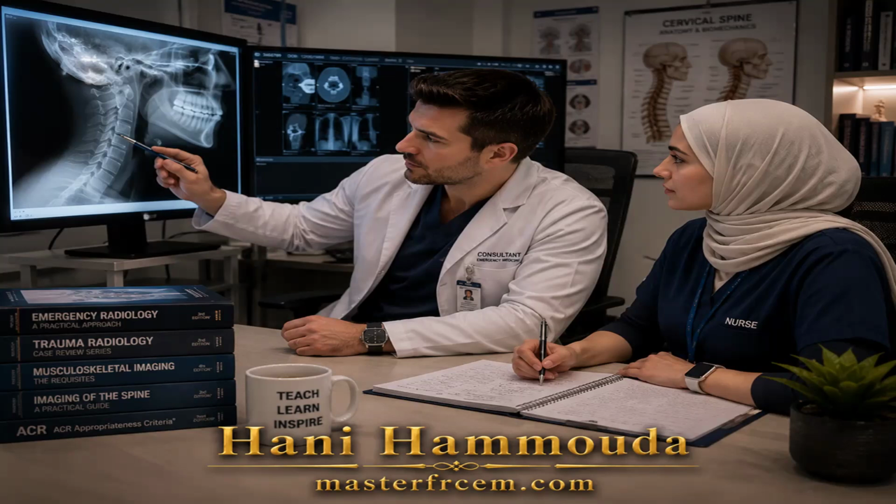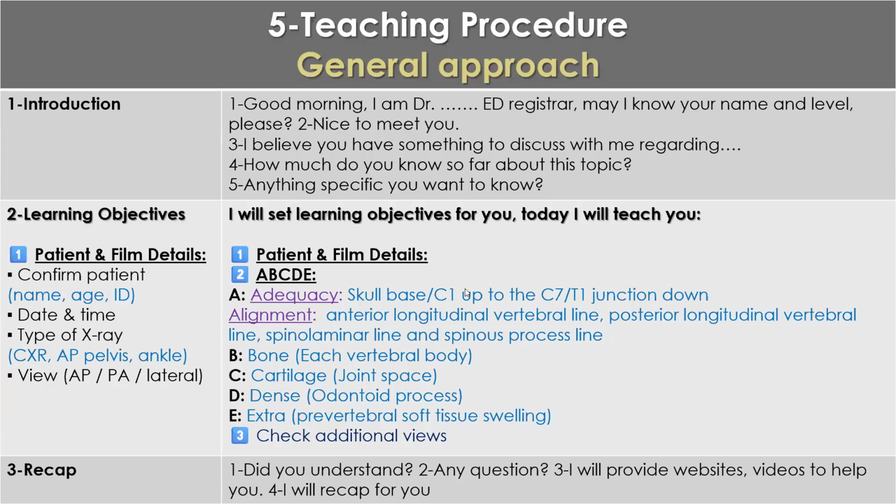If you find no hair, is it adequate? No, sir. If no chin, adequate? No, sir. If no ear, adequate? No, sir. So you should find the ears lateral. You should find your hair clear. You should find your chin clear. Same. So the adequacy means skull base C1 up and C7 T1 junction down, and soft tissues on the lateral sides.